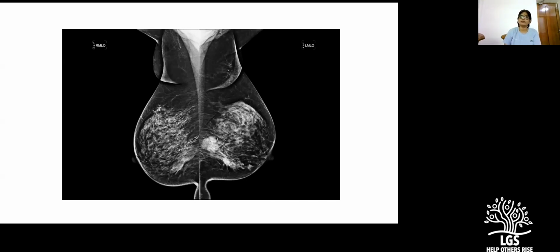And if they've used some talcum powder, then actually give it a good wash, wipe it off, and then do the mammogram, because talcum powder has a lot of calcium. You'd find a very smudged image, and it can be quite confusing.